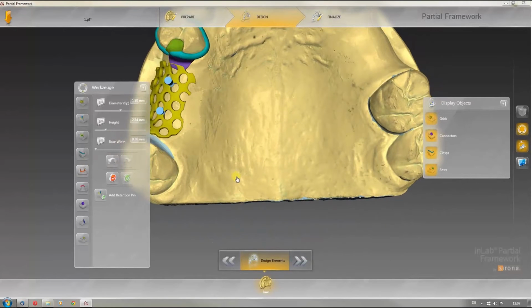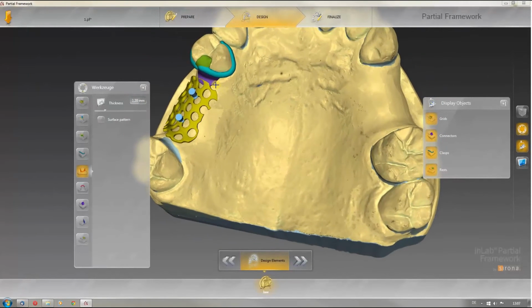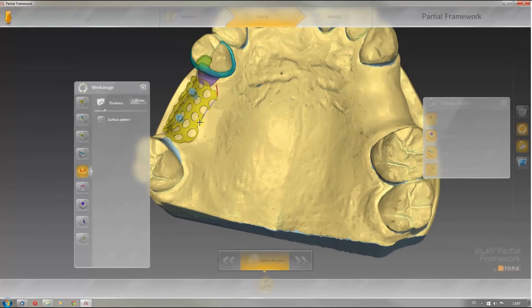Working along, you'll now enter the baseplate. You can construct different baseplate forms, as you may adjust the form of the holes in the plate. Of course, it is much easier to mark the baseplate if it is drawn on the model.